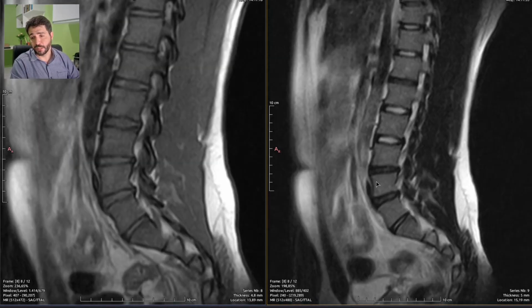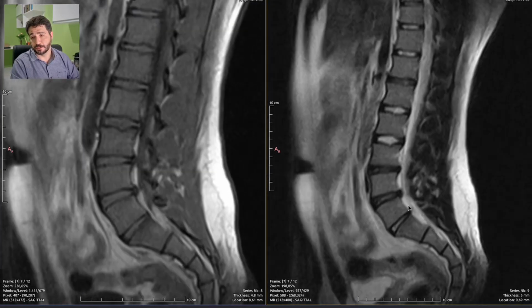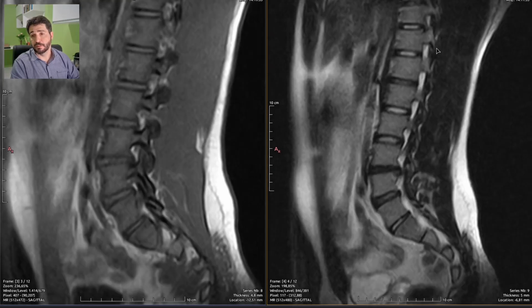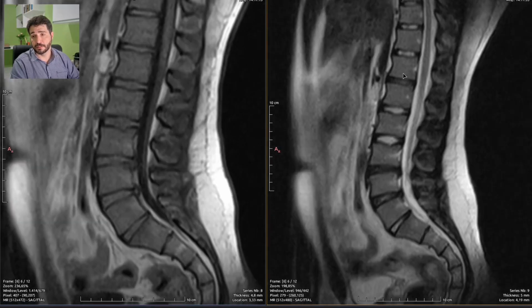So, as you guys can already see, there is an anomalous joint on the end of the lumbar spine in the transition to the sacrum. So let's see, this is the last rib. If this is the last rib, this is D12. So this is L1. So we have L1, 2, 3, 4, and 5.